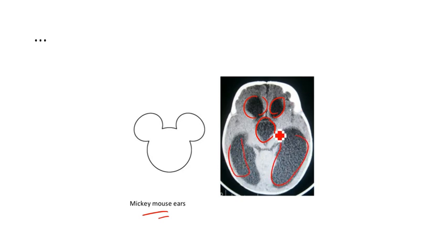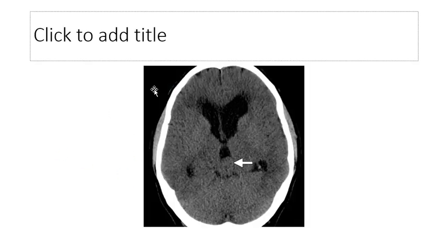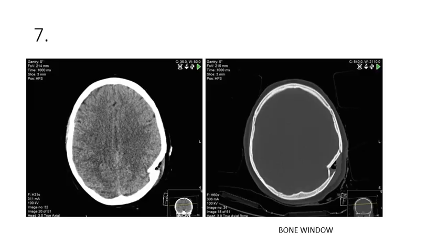You see them grossly dilated like that, you have to think about hydrocephalus. And finally, the moment you have rounding of the third ventricle, the third ventricle is supposed to be slit. The moment you see it round like that, again, those are features in keeping with hydrocephalus. All right, that should have been very helpful.